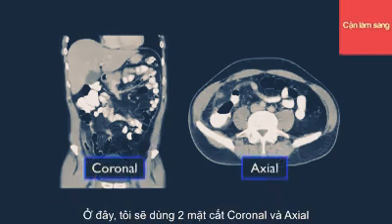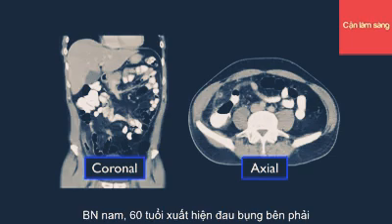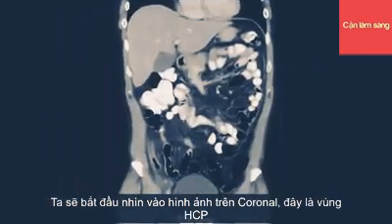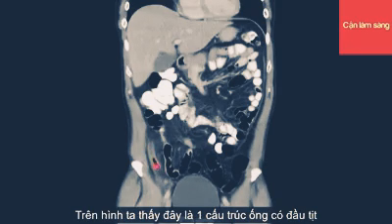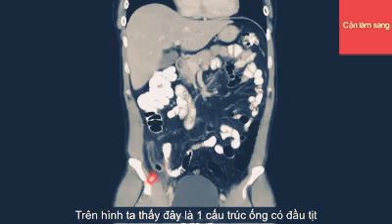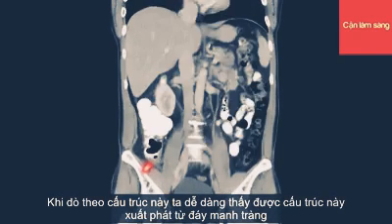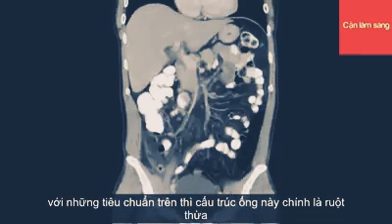And we're going to do it by looking at axial and coronal images from a case of a 60-year-old male presenting with right-sided abdominal pain. We're going to begin by looking at the coronal images. And you can see here in the right iliac fossa that there is a blind-ending tubular structure. And as we follow it back, we can see that it arises from the base of the cecum, consistent with it being the appendix.